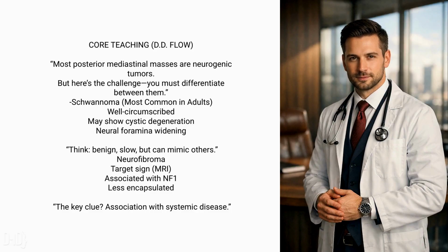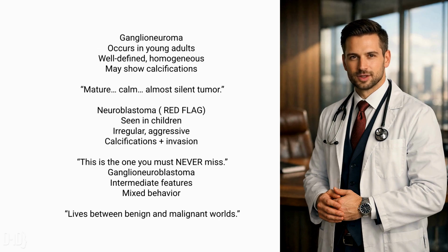Neurofibroma. Target sign, MRI. Associated with NF1. Less encapsulated. The key clue? Association with systemic disease. Ganglioneuroma. Occurs in young adults. Well-defined, homogeneous. May show calcifications. Mature, calm, almost silent tumor.